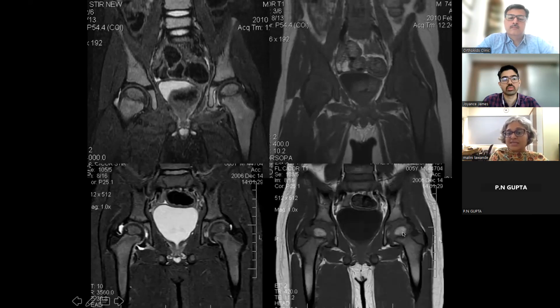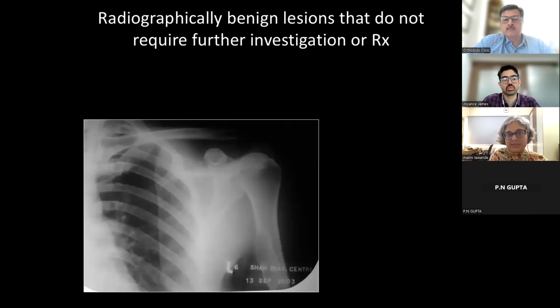And just to show the same age normal child, MR, this is the normal fatty marrow in the femoral head. This is red marrow, which can get confusing. So if I just look at STIR, I'm not sure, is this red marrow, is it not? But I look at T1 weighted image, it's very dark. This is leukemia. And we obviously don't want to miss this.